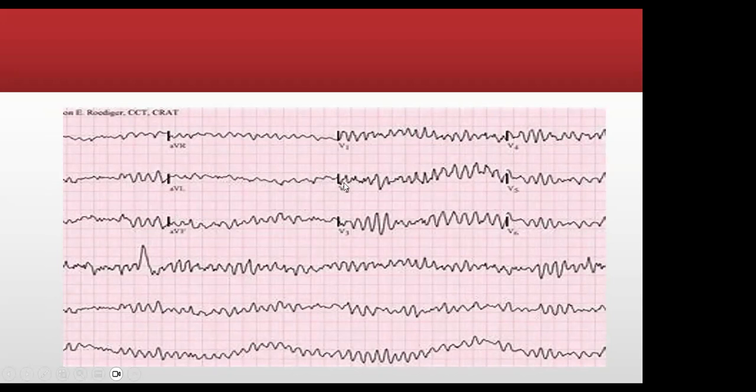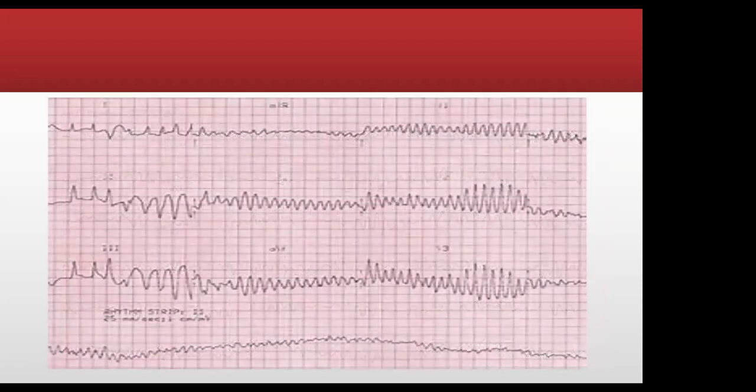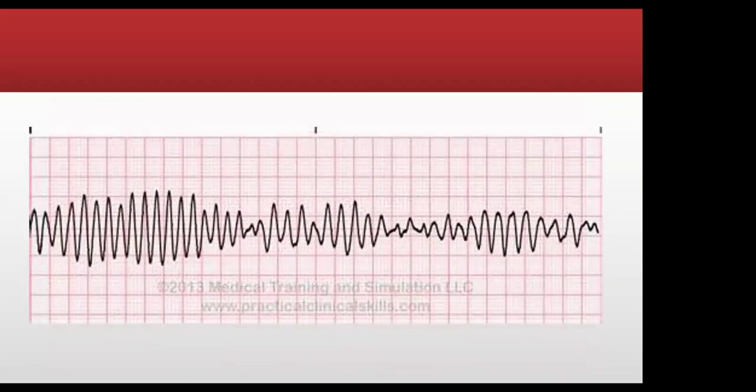because they could flag this for you in a cardiac arrest. You could paint a picture of a cardiac arrest, flag this, and ask whether this is a shockable or non-shockable rhythm. This is to start. We are on the treatment. Magnesium, IV magnesium, is the treatment.